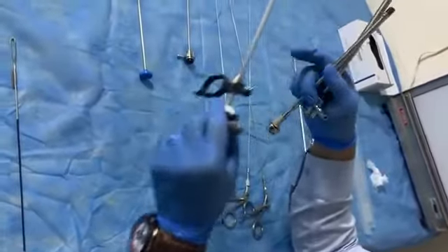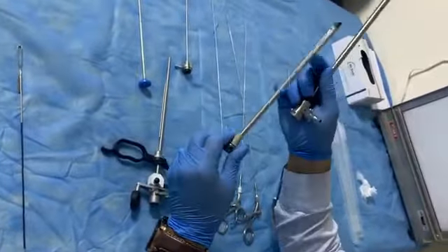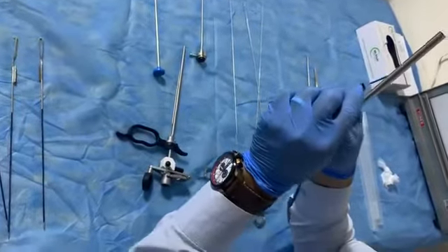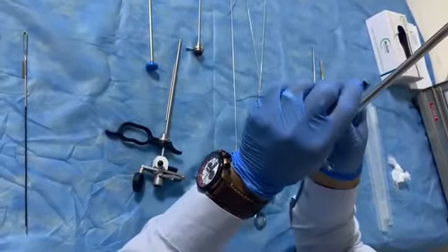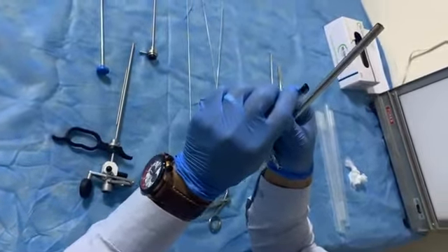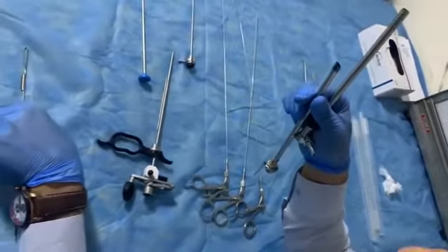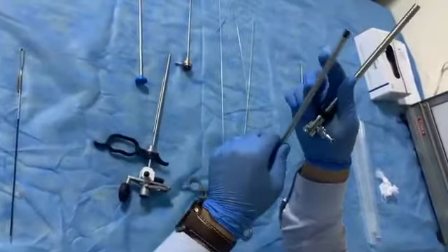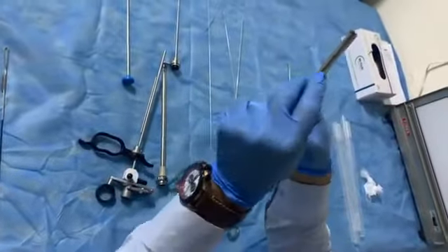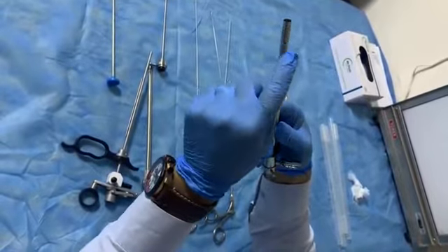So about this part, we have inner sheath and outer sheath. Inner sheath, it's insulated from here. Insulated from here to avoid transfer of current, which occur during use of this electrode. I will show you later. And this outer sheath contains many orifices for exit of fluid.